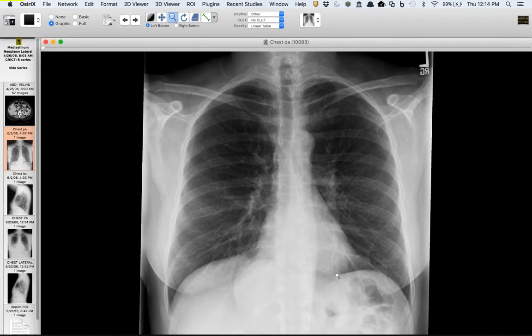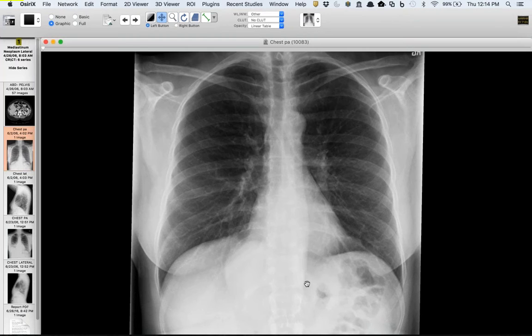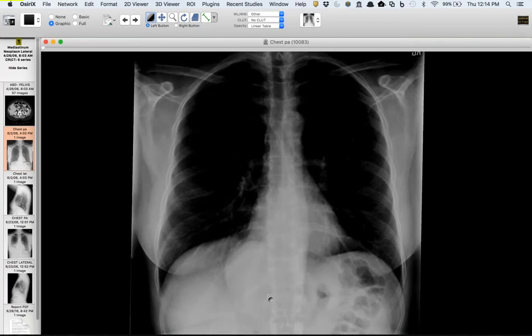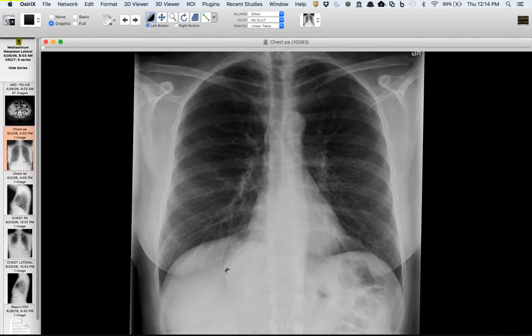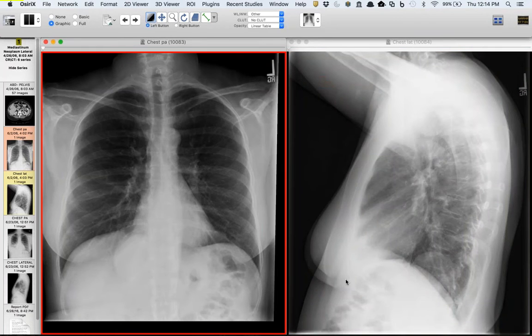Here, again, I'm saving some of these for some of my residents since we're early on in the year. I think this is a nice example of a potential blind spot on the PA radiograph, and it's a slightly unusual appearance for this common entity, but you can see, or hopefully you see, that there's a weird curvilinear opacity projecting over the right hemidiaphragm. So keep that in mind when we look at the lateral view. And here you can see again why I think the lateral in a lot of cases makes things a lot more apparent, and you can see it's more posterior and it's medial.